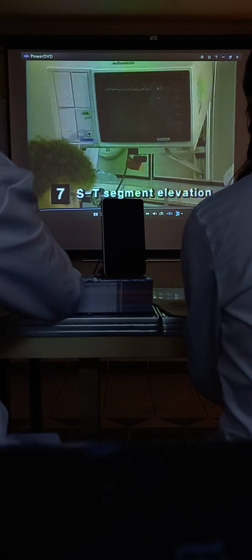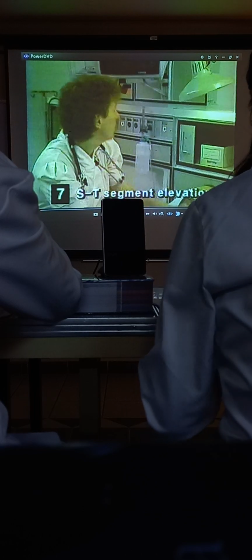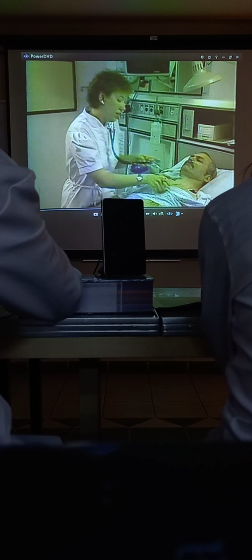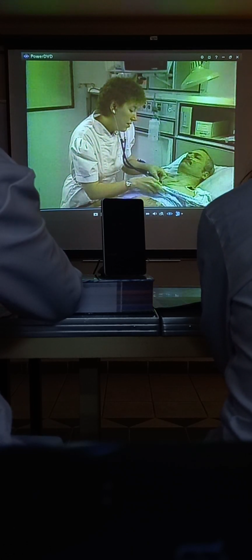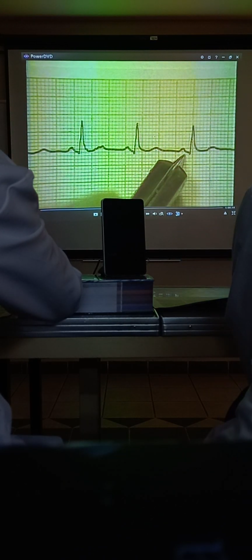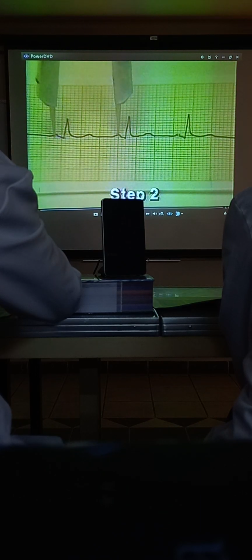The next patient was just admitted to the CCU. He is male, age 49, and came to the emergency department complaining of substernal chest pain. In the CCU, a baseline EKG is being reported. The P wave is present. The amplitude is variable. The atrial rhythm is regular.